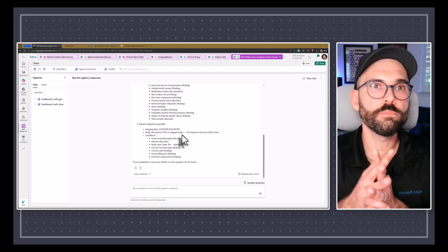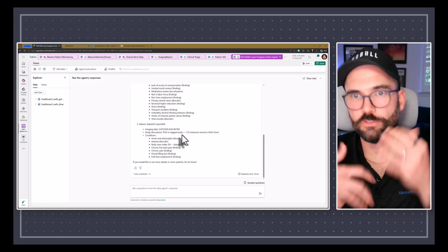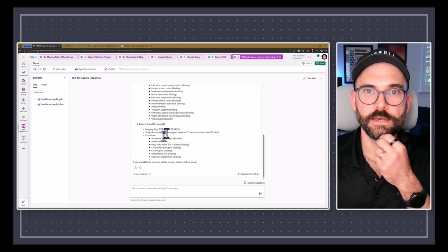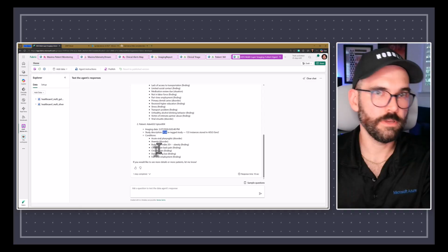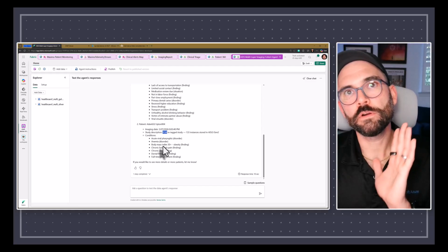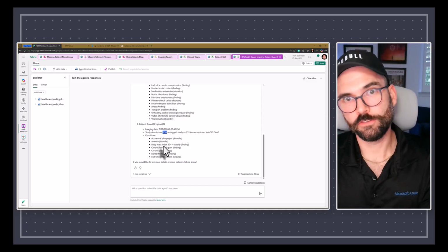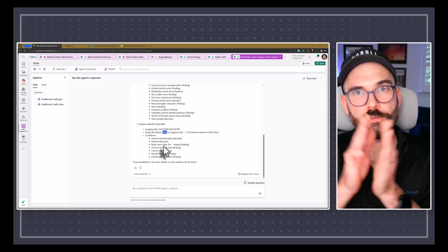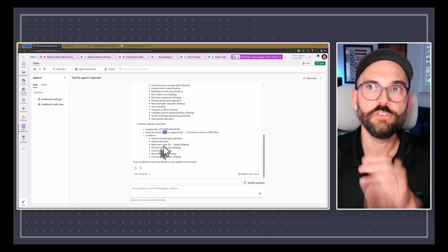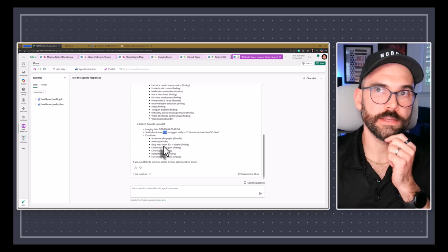These are all pre-built studies. The images are all pre-built coming in from this TCIA organization's repo for testing. Remember, we are generating patients. So in the subsequent part of this video, I'm going to talk about how we tie all these things together. Just know this is how I can interact with the data.